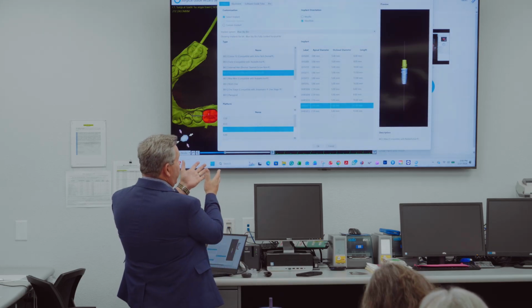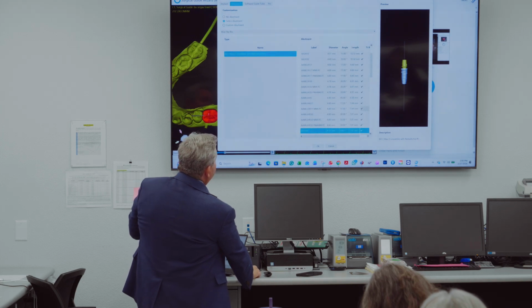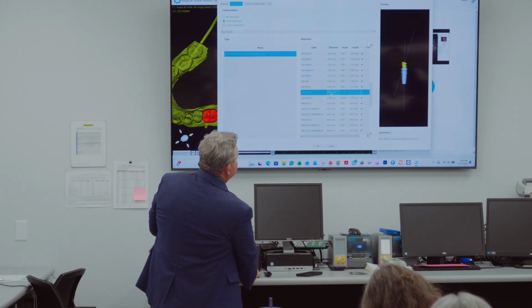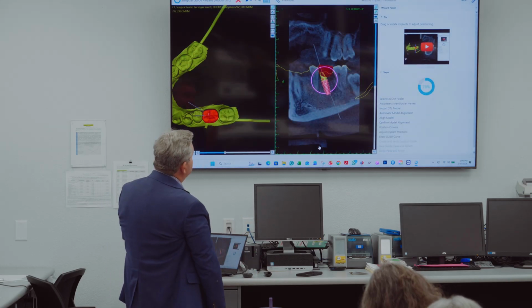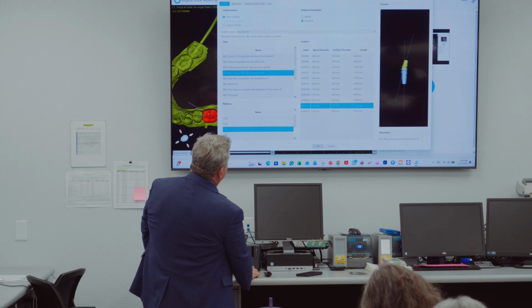and it goes back to the screen, which you recognize, okay? And we go to the abutment tab, and here we go. So what do we think is going to go in there? A 17 maybe? That's a multi-unit there. Let's see. Let's do this one right here. Oh, that's a locator. I don't want that one. Is it this one here? I don't know all the product codes. That's a multi-unit. Maybe. There we go. Okay, 15. See what that looks like. Update. Take it here. Click OK.